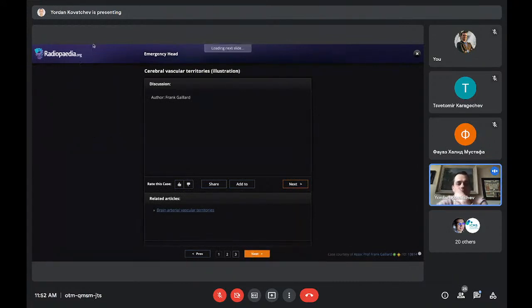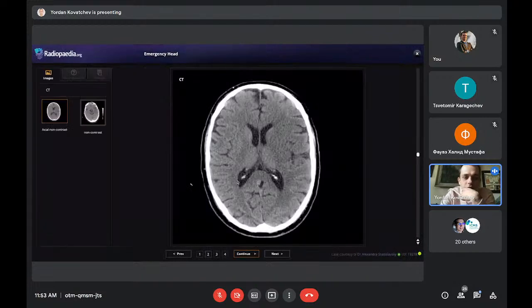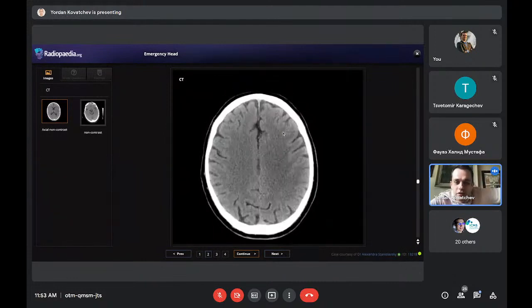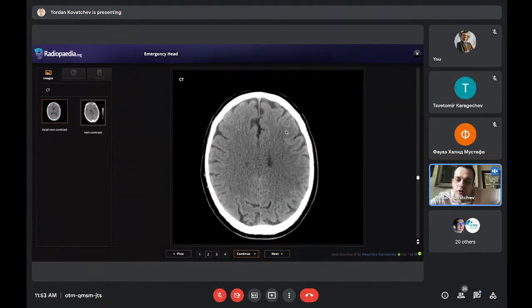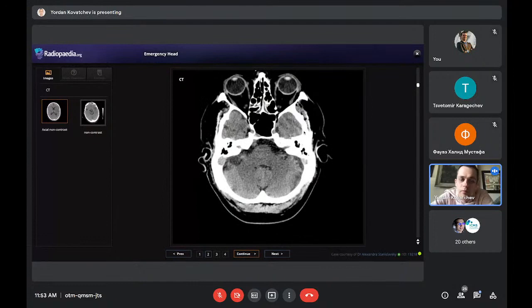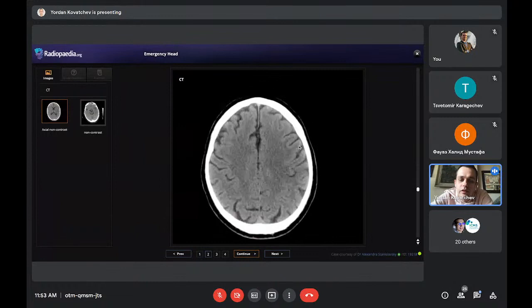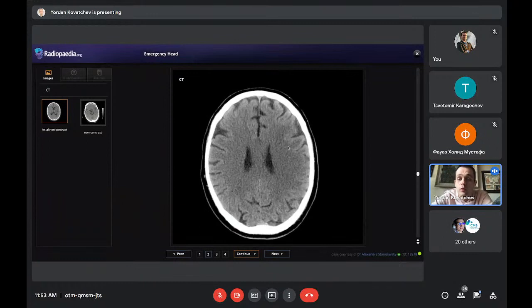So I think on the next part, I'll go straight to a case. Yes, a 70-year-old male. You can also open this yourselves. It's in the playlist. A 70-year-old male with altered conscious state. And okay, all of this boring stuff that you're listening to me right now. Let's get to business. Actually, you're a radiologist on the night shift. This guy comes to you. They send him to you from the emergency room. You have no information. You're tired, and then you open this head CT, and there is a subtle change that you have to notice. This is really what I want you to.